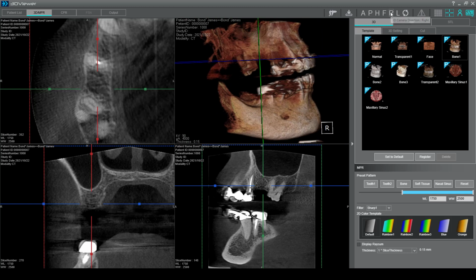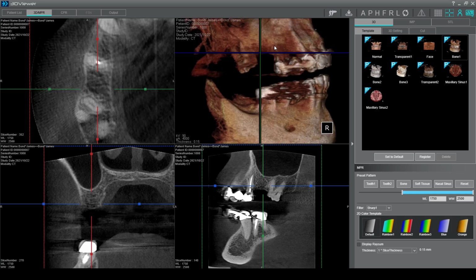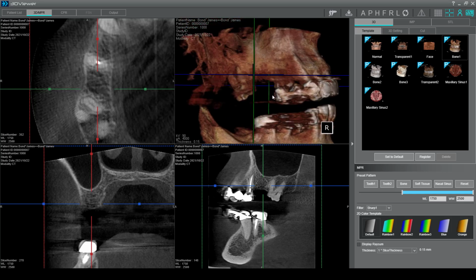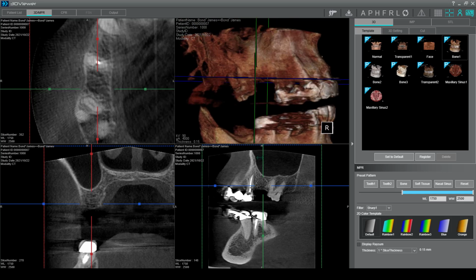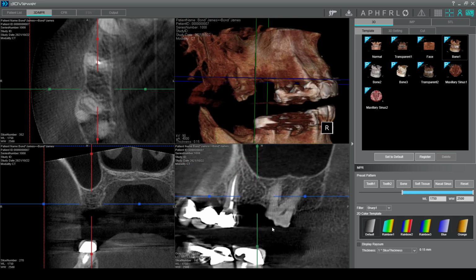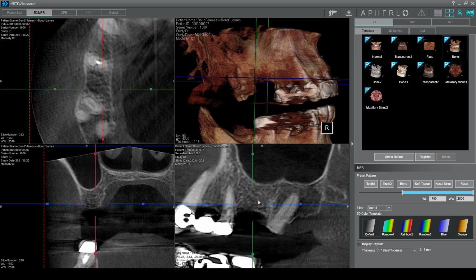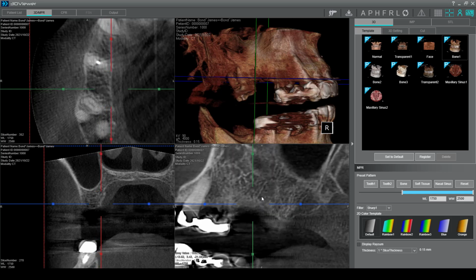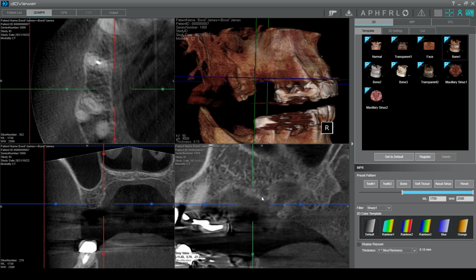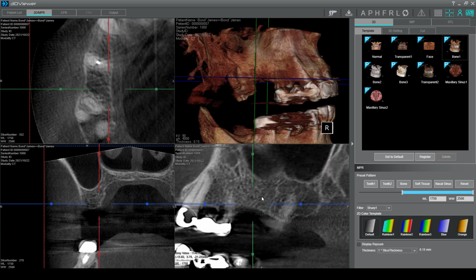So I'm going to snap this to the right. And the very crosshair here is exactly where we're looking. I'll give you a little bit of a sideways view. That's exactly where we are. Okay, so now we've got some pretty good range here. Generally we can see everything. There doesn't look like any obvious obstructions or anything like that. The pathology looks generally good.